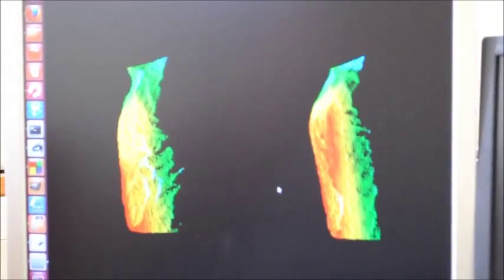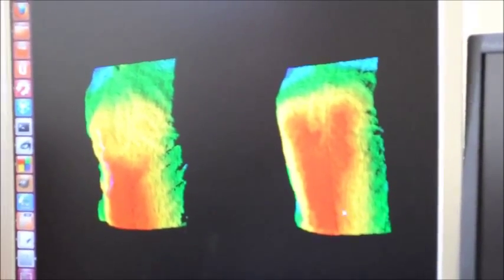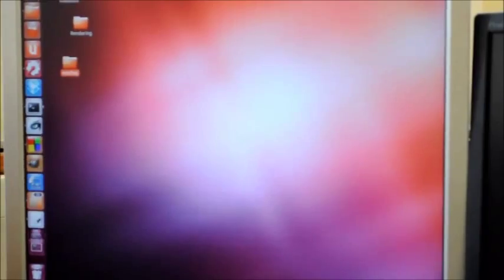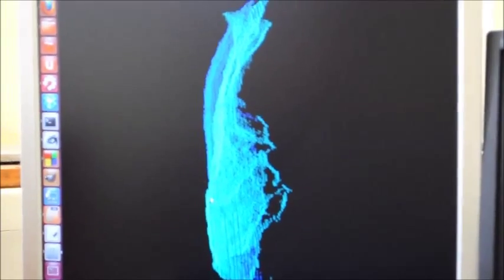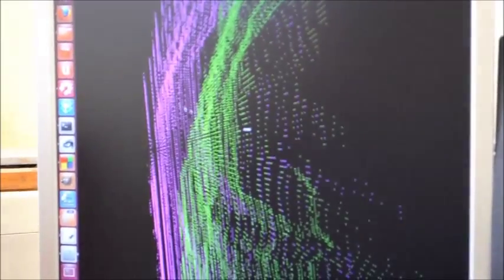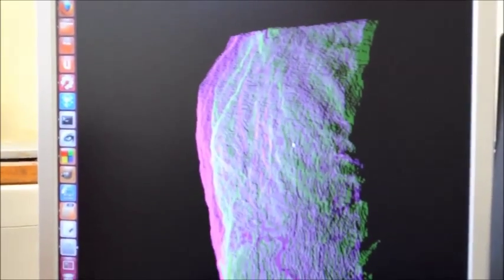Now we can get all sorts of information about the volume and the size of these point clouds, but before we do that, let me show you a comparison if we overlay those point clouds on top of each other. So let me change the color. You can see that inhaling is the one in pink and exhaling is the one in green, and you can see there's a visible amount of difference here. So we can easily find out the change of the volume between those 2 clouds.